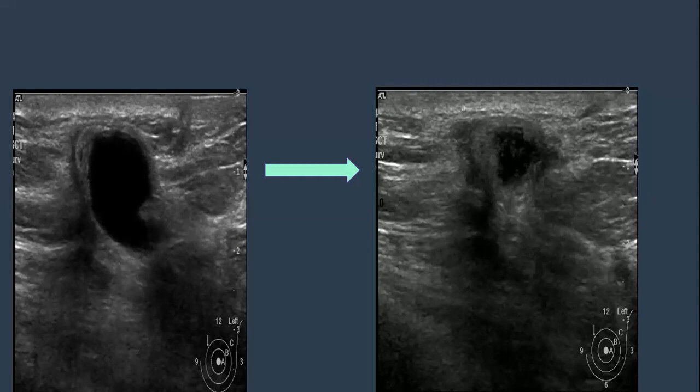What can cause spiculations that mimic malignancy, but it is benign? A benign mimicker of malignancy at the site of post-surgery. Necrosis of the previous tumor.